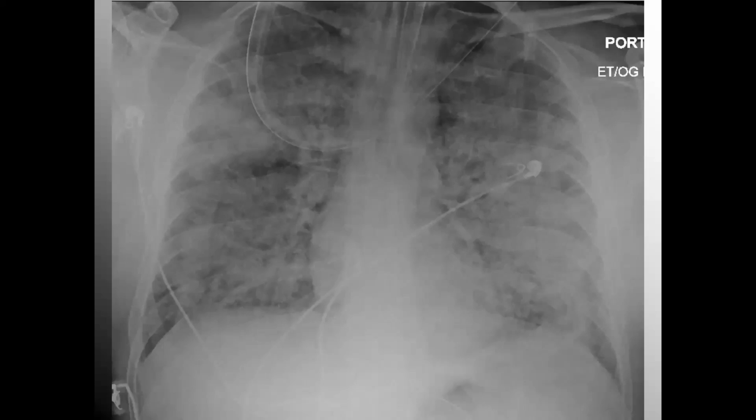So what do you see here? Well, there's a lot more to see and do. It's like going from Six Flags to Disneyland. Now there's a lot more. So you've got the airway that is difficult to delineate, although I do now have an artificial airway. So we've got this radio-opaque line, and you commonly look at the ET tube, yes, we need to know it's in good position. The depth of insertion is adequate. Usually depth of insertion is just a couple of centimeters or so above the carina.